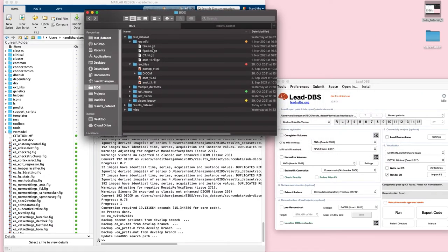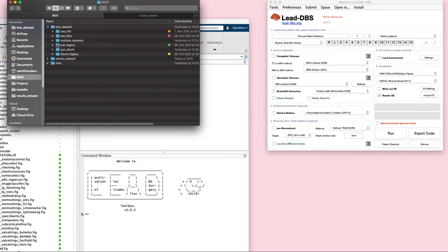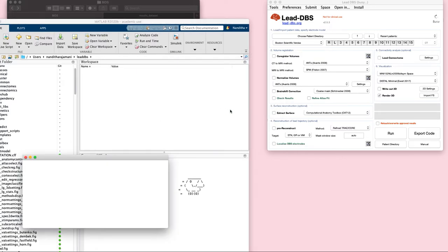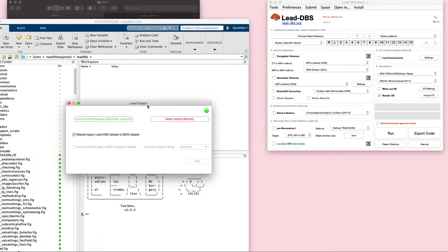This here is gzipped, so it has a nii.gz, but you can also use just a .nii extension. I will simply drag my dataset which I want to be converted into a BIDS compliant version directly into Lead-DBS, and that will open a dialog box saying raw dataset with NIfTI files only detected, and would you like to migrate it to BIDS? So I say yes, and this opens another application which is called Lead import.